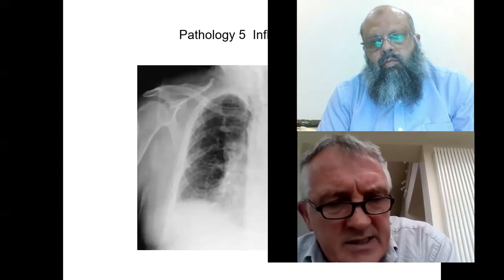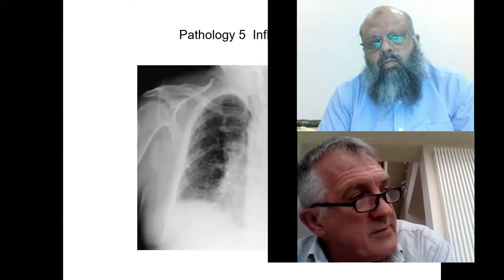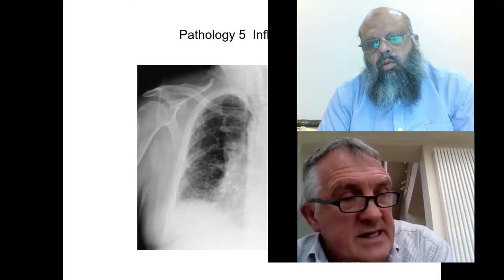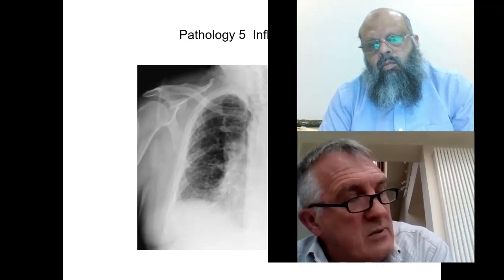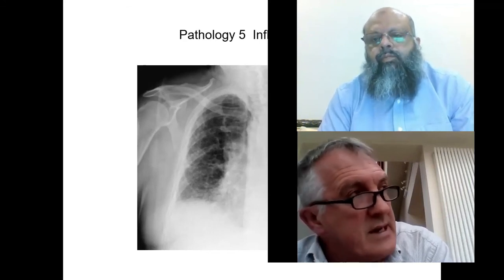You can obviously get lung cysts and cystic lung disease, and there are general differentials of cystic lung disease, from neurofibromatosis, tuberous sclerosis, etc. But so can emphysema, etc. And the lines and nodules generally mean an interstitial process. As you know, the interstitium is a connective tissue that holds the lung together. And you get thickening of the lymphatics and the interstitium, and that's typical of an interstitial process, which is a completely different process to airspace shadowing, where the pathology is actually in the alveoli.